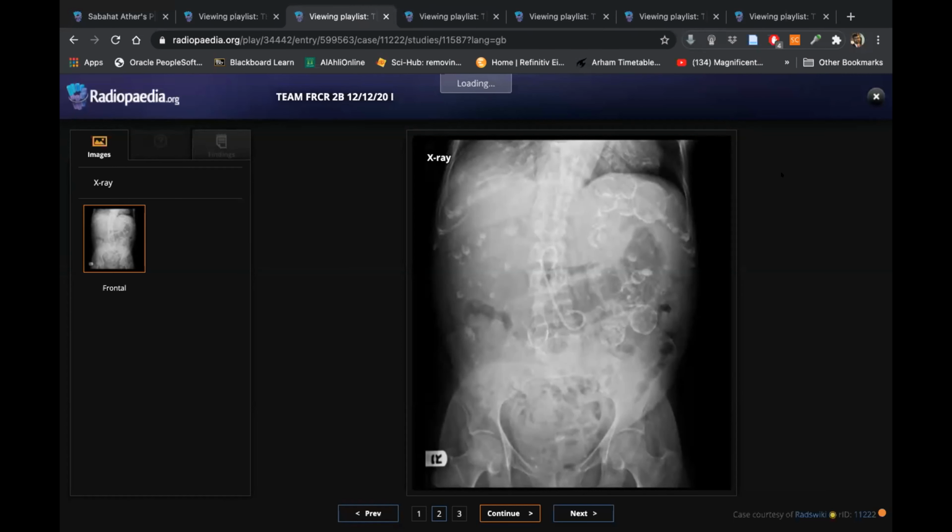And since it can be autosomal dominant, like autosomal dominant polycystic kidney disease. Excellent, yes, this is what it is. It's a very severe form, long standing, and basically the kidneys are enlarged and the cysts have been peripherally calcified. Excellent. Give me a few associations with ADPKD.